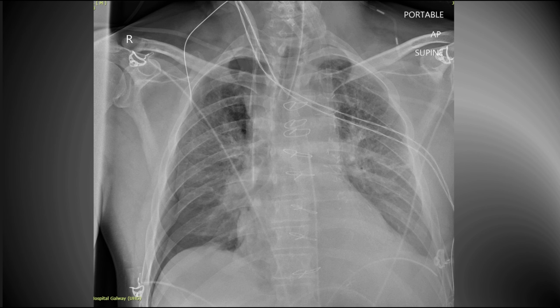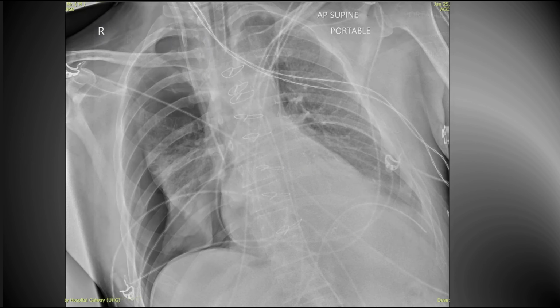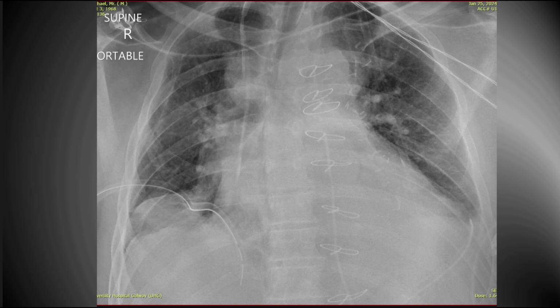This is a patient post-cardiac surgery. Everything looks fine here. But several hours later, the patient desaturates and his airway pressure increases, and this reveals a pneumothorax on the right. This is a common phenomenon whereby the airway pressure suddenly rises in a patient who is ventilating normally, and in that scenario you should always think about pneumothorax. For this patient, it was easily resolved by placing a chest tube.